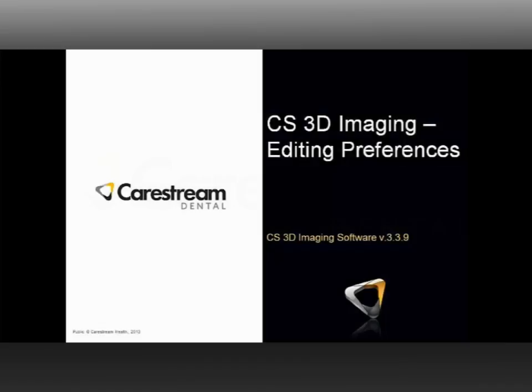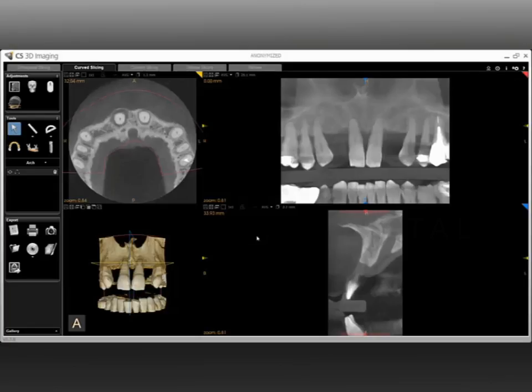In this lesson, we will learn about the preferences in CS 3D Imaging. We will look at what they do, what's recommended, and how to edit the preferences to customize the program for yourself. The preferences discussed here are for version 3.3.9. If you're not on the current version, please go to carestreamdental.com to update.